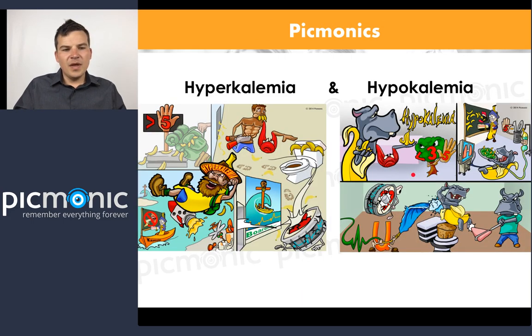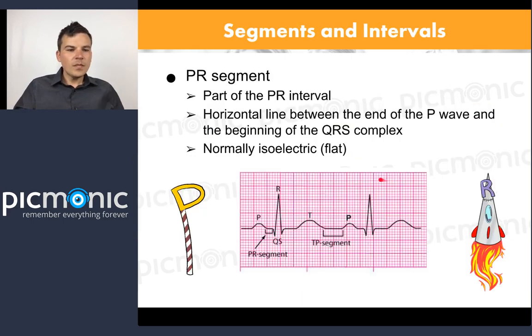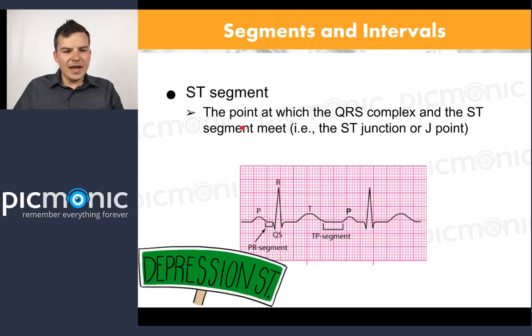So here's just our potassium Picmonic, so you can go check that out if you want. I'm just going to skip ahead, since I already talked about each one of these, but I want to talk about the ST segment. So as we look at the ST segment, this segment right in here, between the S and the T, what is the ST segment?